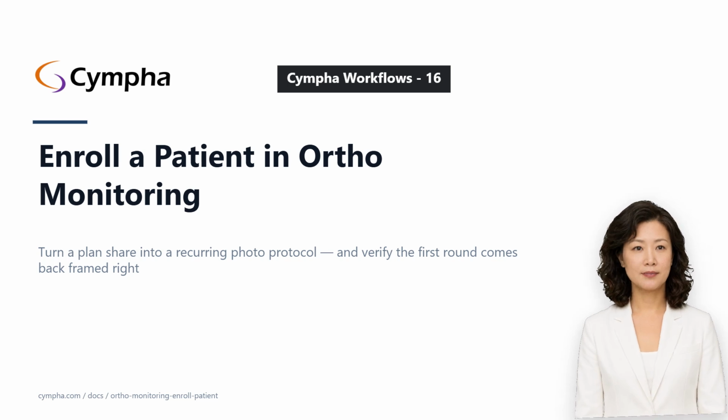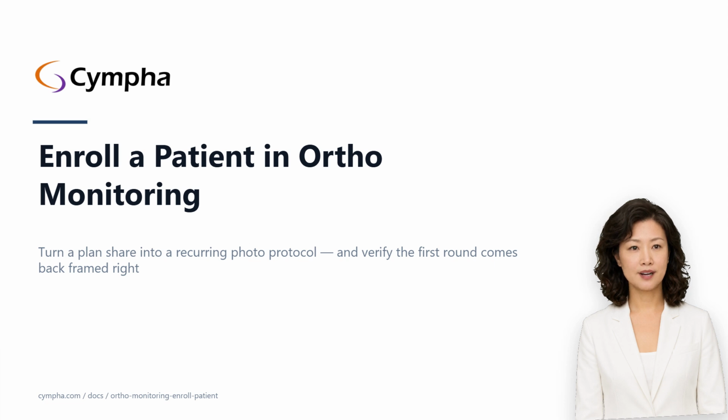Welcome to Guide Mia. Today we're going to talk about enrolling a patient in ortho monitoring. This one is for orthodontists, general dentists running clear aligner cases, and practice managers who want progress photos between visits instead of guessing until the next appointment.